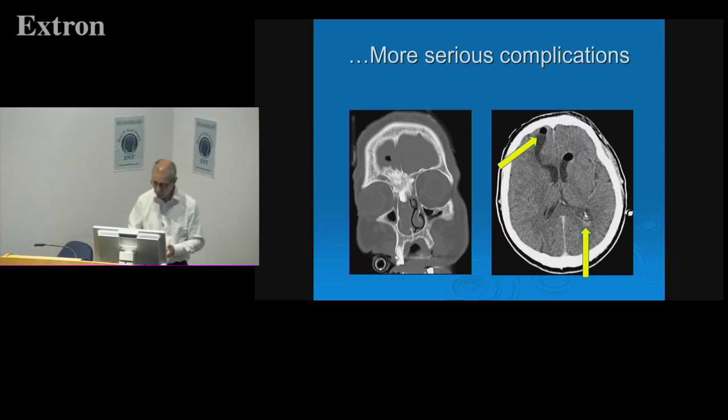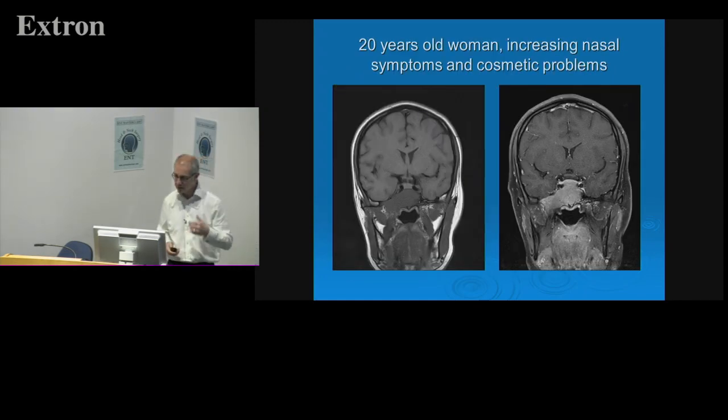The large arrow at the bottom there showing the debris within the lateral ventricle just sort of layering at the back. So they can actually be more serious than they usually are, but we need to keep an eye on them.